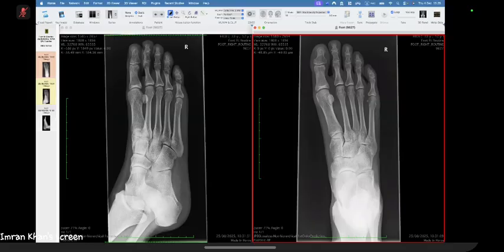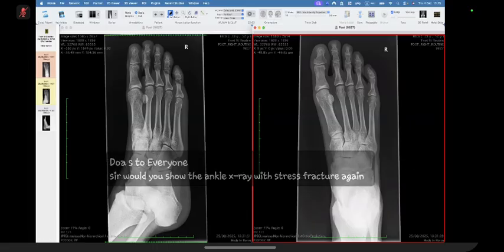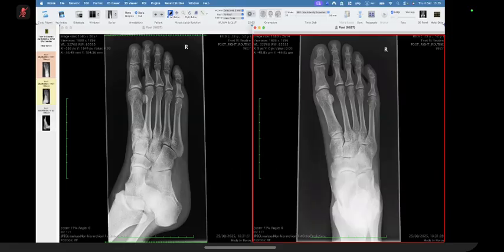The way I would approach it is I would put myeloma as a top differential rather than METs, because of the significant number of lucencies that you see. So myeloma would probably be my top differential, not METs. The question is whether they're asking for one differential or multiple. If they're asking for multiple differentials, then myeloma, METs, and then hyperparathyroidism would probably be the top three.